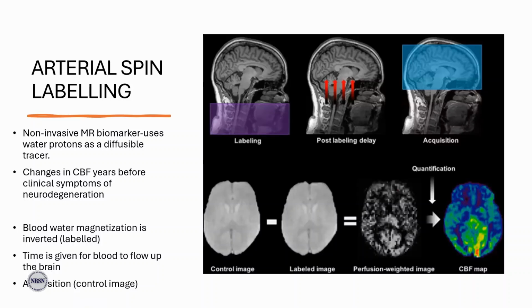So basically, areas of the brain where there is activity, where there is metabolism, will light up, and when there is no perfusion or metabolism, those areas will show paucity of color flow, or color map rather.